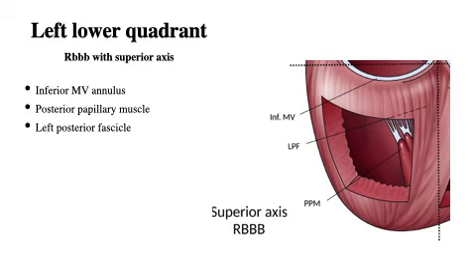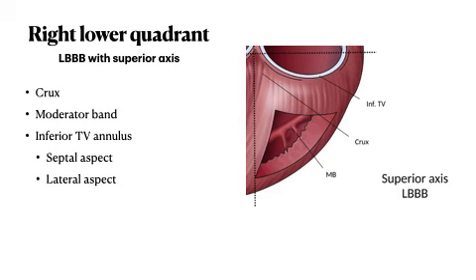An RSR pattern and a QRS duration of less than 130 milliseconds suggests early recruitment of the His-Purkinje system, seen in PVCs from the LPF. The cardiac crux is an epicardial space where all four chambers of the heart are in closest proximity. It's also the junction of the MCV and the CS. PVCs from this area have a left superior axis, an early V2 transition, and features suggestive of epicardial origin, such as pseudo delta or a maximal deflection index of more than 0.55.